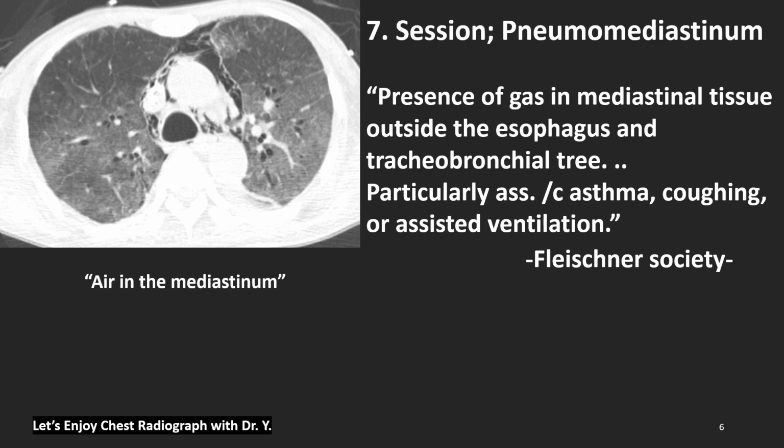Now let's begin our new session. Session 7, Pneumomediastinum. The Fleischner Society tells us that pneumomediastinum is the presence of gas in mediastinal tissue outside the esophagus and tracheobronchial tree, particularly associated with bronchial asthma, severe coughing, or assisted ventilation. How to say it simply: air in the mediastinum.